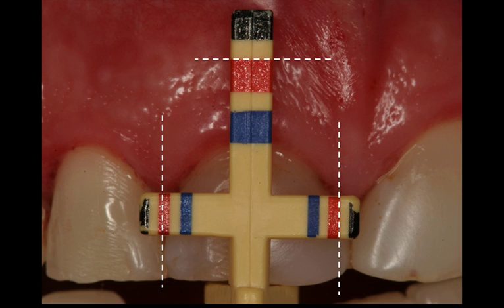Okay, so you don't follow it blindly, because if you just resect tissue based on the proportion gauge, you may run out of good tissue. Like in this case, you may lose all of the attached keratinized tissue. So this helps you to visualize and plan teeth proportion, but it's still up to you how to do it surgically and follow all the rules of biology and surgery. Okay, so keep this in mind.